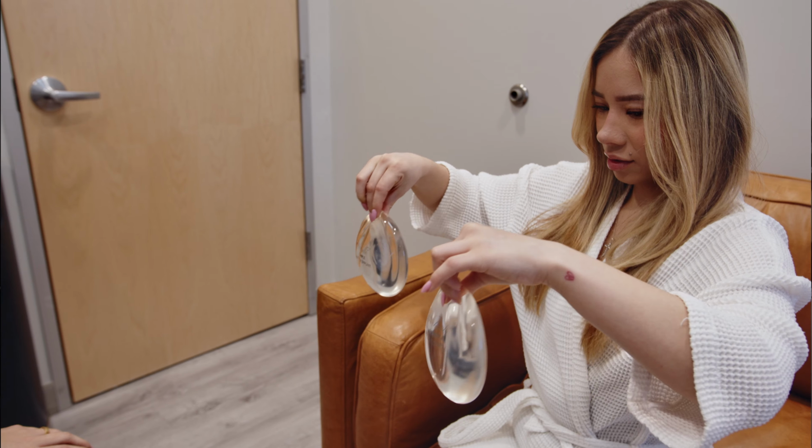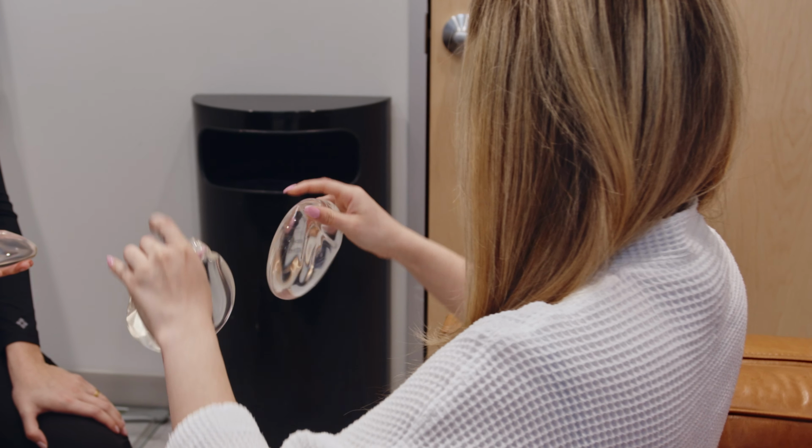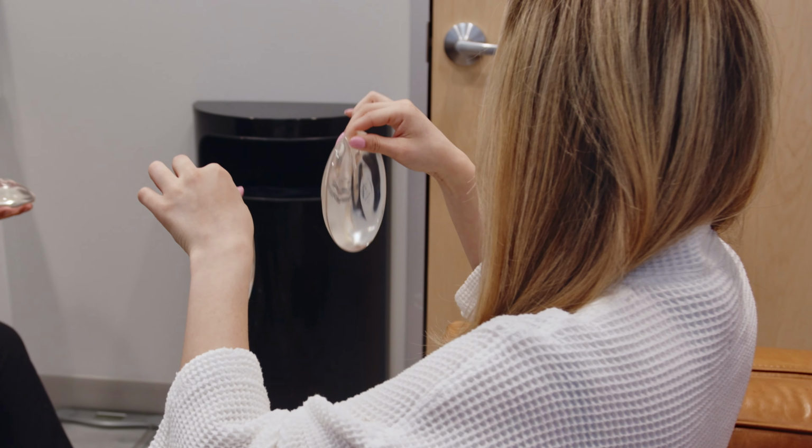We're going to talk about how to choose an implant profile, size, kind of all of that together. So I talk about breast implants all the time, which is kind of fun. But what happens is people come in and they read all this stuff and there's so much different verbiage, so many different things you see that it just starts to get overwhelming and you don't know which way is up. So hopefully we'll go through my interpretation of these things throughout this video to help give you a better idea of potentially the right questions to ask and how to get to the right implant for you. We're going to start off by talking about profile.